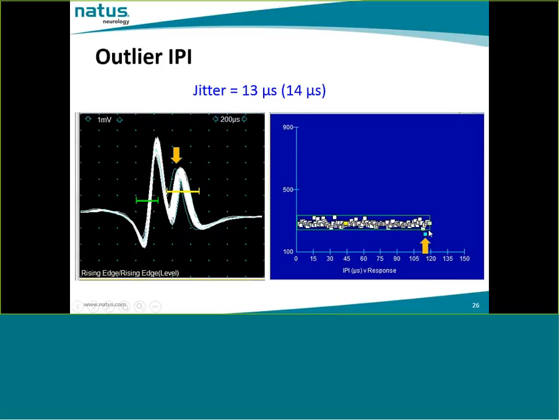These are about 120 discharges. As I indicated earlier, using the rules of statistics, 3 standard deviation band contain 99% of the data. So if you had 100 sweeps, we will expect to see one outlier. And this fits the model of statistics very nicely. And this actually gives me more confidence in my analysis, that my data indeed has a good Gaussian distribution in this recording.